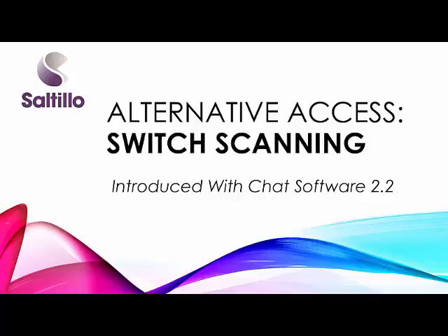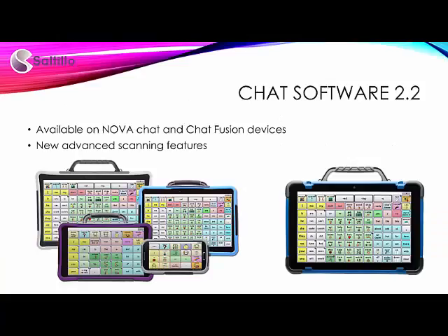This tutorial will explore the scanning features and settings available in version 2.2 and higher of the Chat software. Chat software is found on the Saltillo NovaChat and Chat Fusion devices. The features I will explore are developed specifically for individuals using switch scanning as their alternative access method to communication.